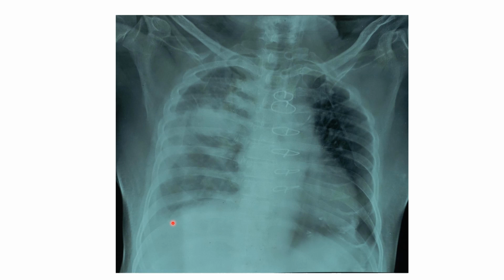So when the patient is erect, because of gravity, the fluid tends to accumulate in the lower areas as a dependent opacity. But when the patient is supine, lying on a bed, sometimes patients are seriously ill and they have to lie down, and you will be taking a supine film. The fluid tends to accumulate in the posterior aspect through and through, and this appears as a diffuse haziness.